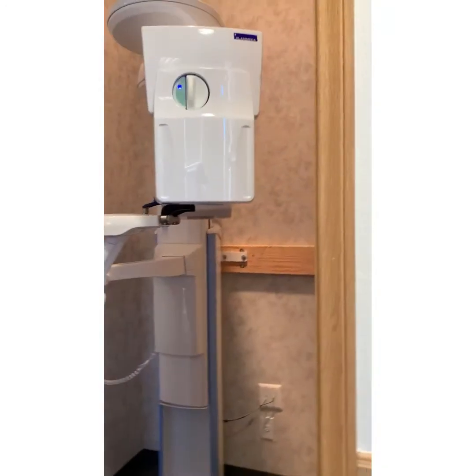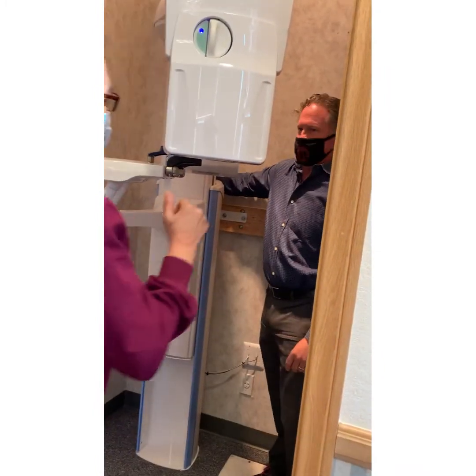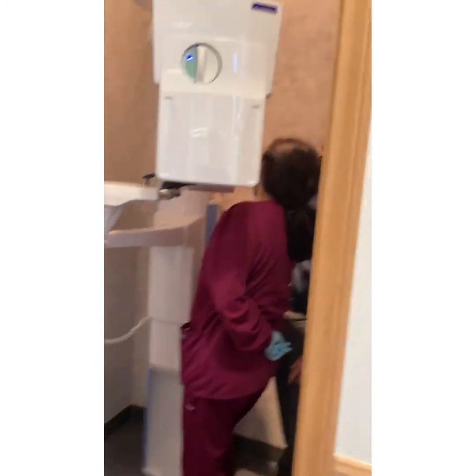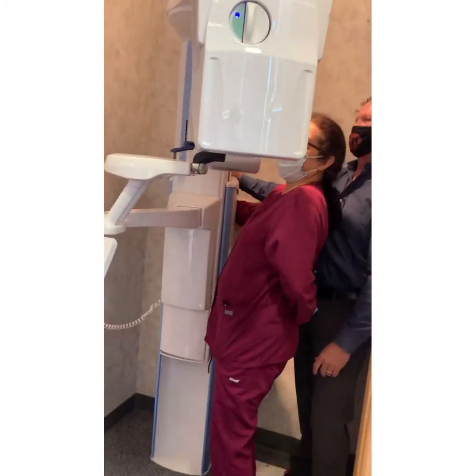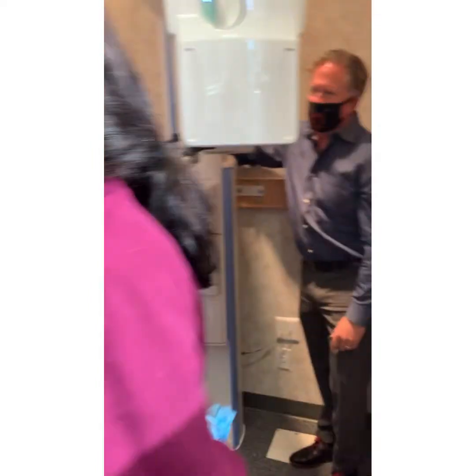Okay, so how do you turn the unit off? There's always that. And should that computer be shut down on the wall every night, or just leave it in sleep mode? I have it set to turn itself off. Right there, underneath, it's like a pen, a button going that way. Okay, there's a button underneath here.